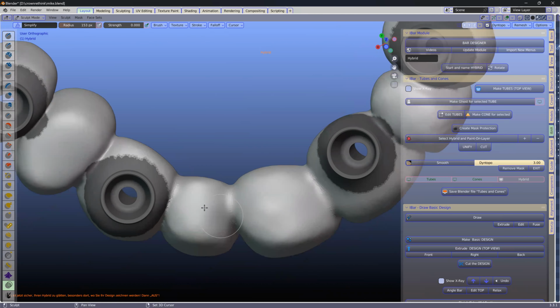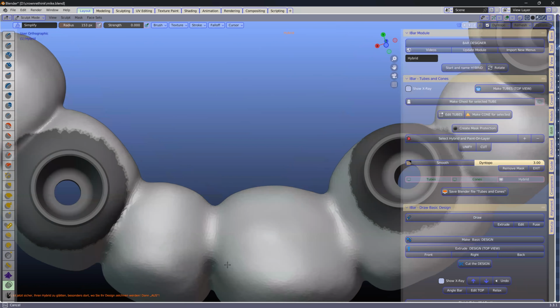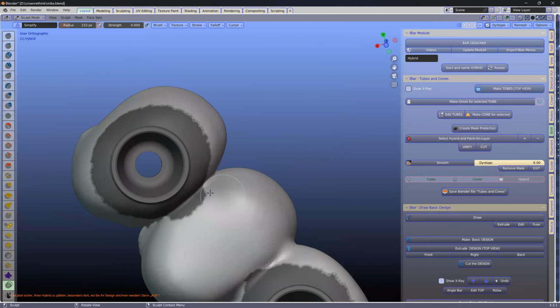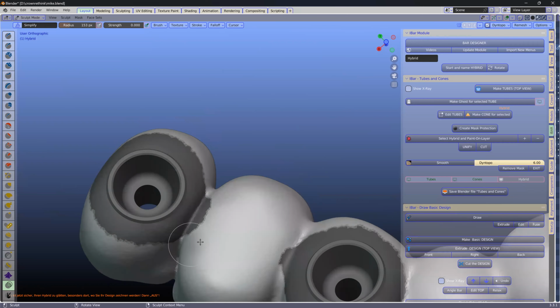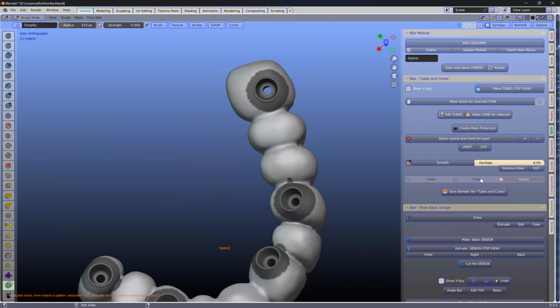It's like a protection. And here, for example, I want to smooth it so that when we put the bar across it, we have a good geometry, a good surface to jump from one tooth to the next. I don't know if I'm making sense. Okay, so when you finish, go exit, and then we're going to start designing.